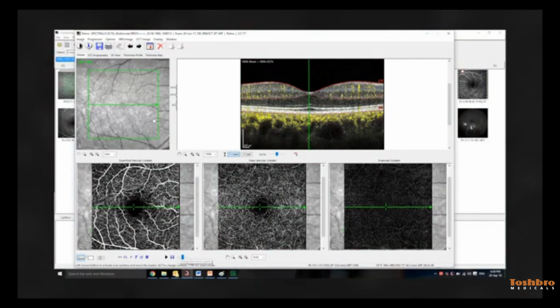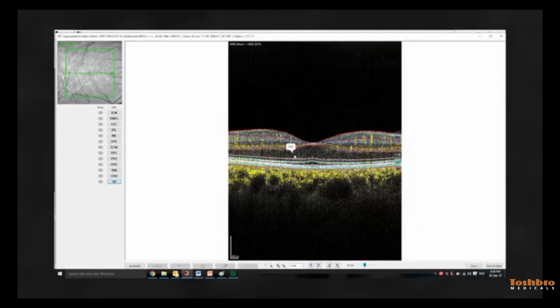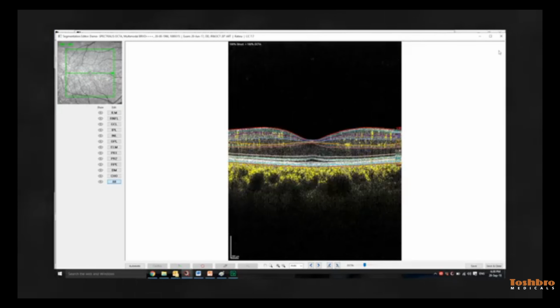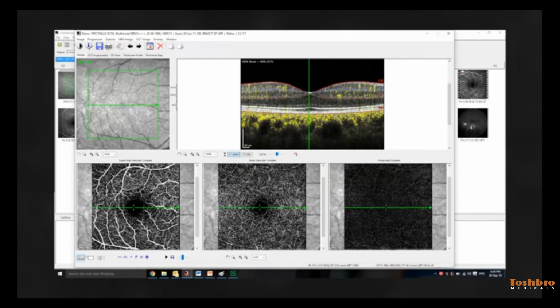When reviewing the OCTA image, we should look at the fundus reflectance image to identify if there is any cause for poor quality data, assess the B-scan image for accuracy of segmentation, and review the en-face OCTA images or transverse section OCTA images to ensure that we're seeing accurate segmentation of the superficial vascular plexus, deep vascular complex and avascular complex.